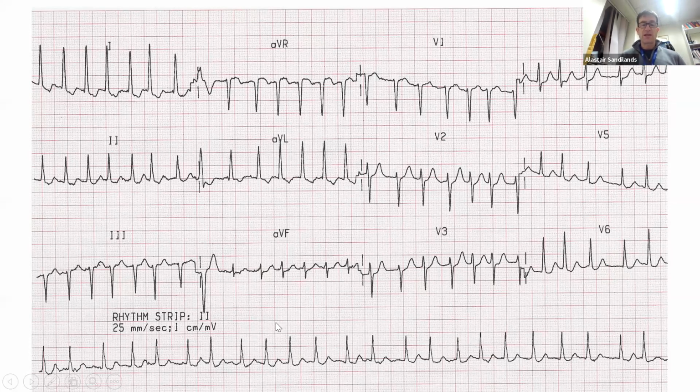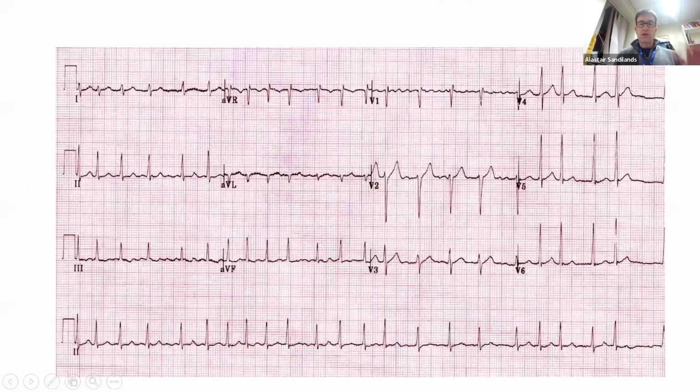It would be the fact that it's an irregular rhythm. The QRS heights vary within a given lead. Any given lead, the QRS height is varying. It's getting taller and a bit smaller there. Within a given lead, even in lead 1, the heights vary. So that just means the conduction of the AF hitting the node is varying every time. In lead 3, we can see the same varying QRS heights, and that's an ectopic beat. So this is atrial fibrillation. Okay, have a look at this one, please.